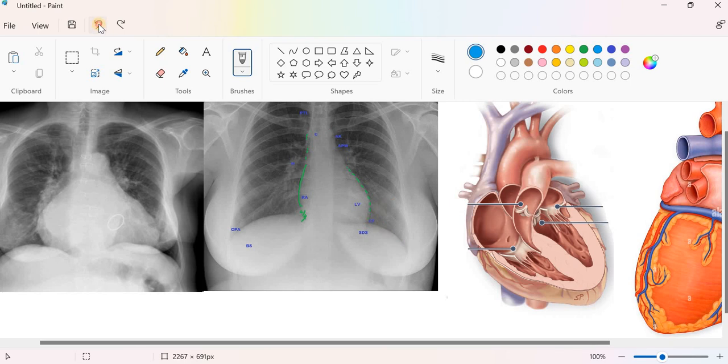Now let us look at the trachea and its bronchi. If you notice here with me, this is the shadow of the trachea. It is a bit translucent, meaning it is a little bit dark gray. And here there is a division, the bifurcation into two bronchi, right and left. Usually the angle between one bronchus and the other is a right angle or less.